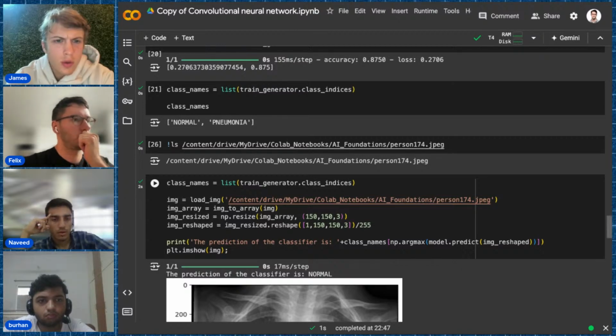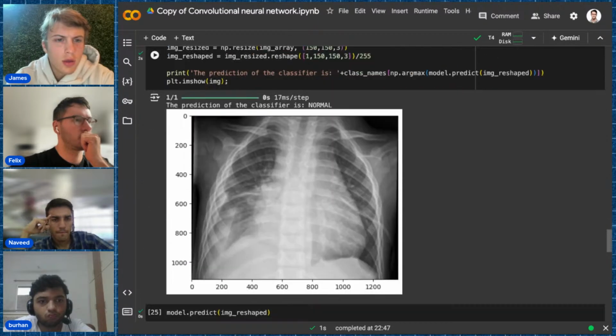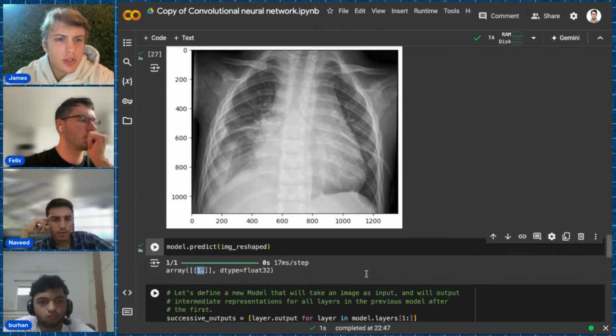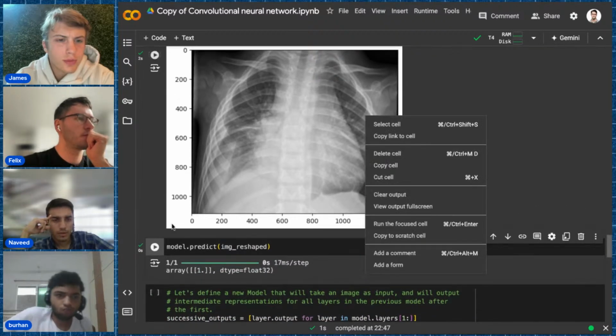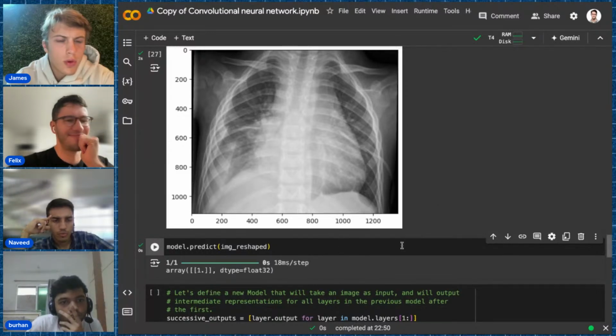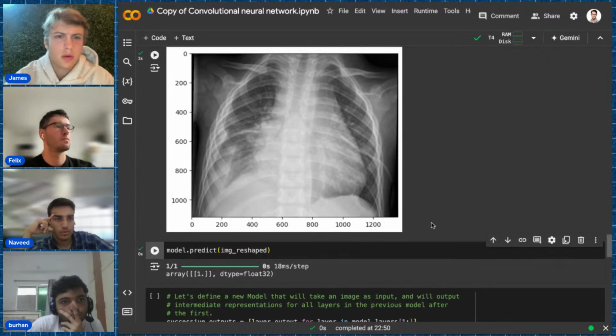So, where is it that it outputs the probability? Here, apparently. Can you run it again? This one? Yep. This is strange. I mean, getting a 1, this should be above. I can't spot the 1 right now.